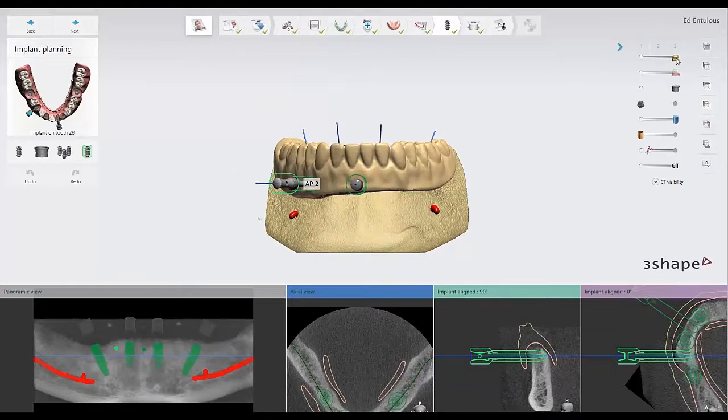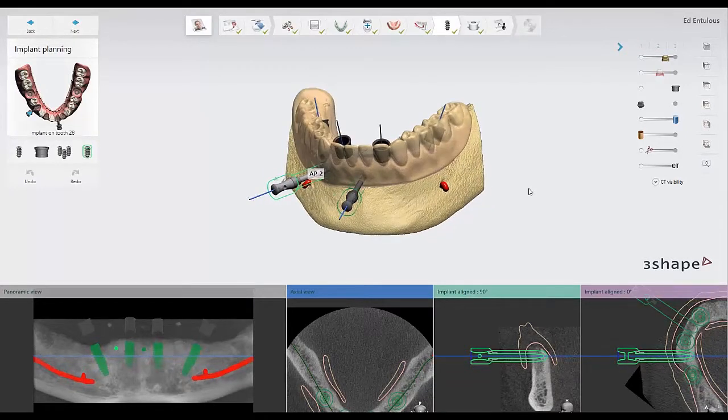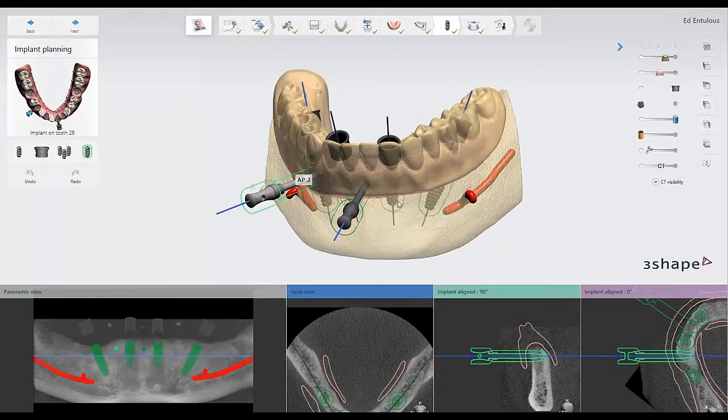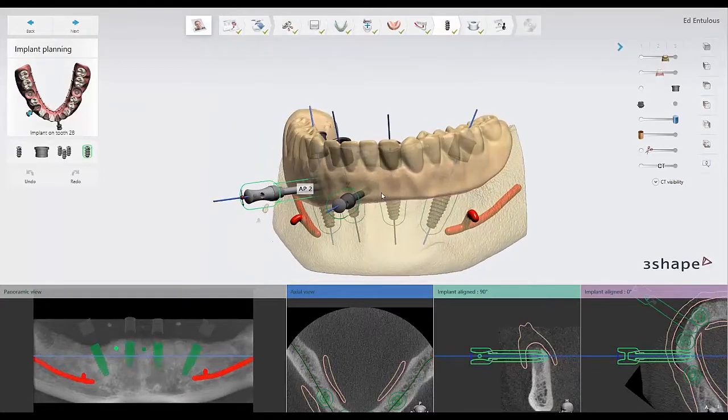But obviously now we're talking about these large full arch cases, edentulous, partially edentulous patients where we're replacing RPDs and similar restorations of patients. So one thing that's going to be crucial in these cases is anchor pins. And as you see here, we have already placed 4 implants in something that could resemble an all-on-4 case, and we've placed 2 anchor pins.